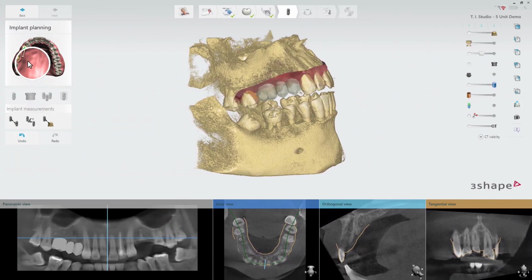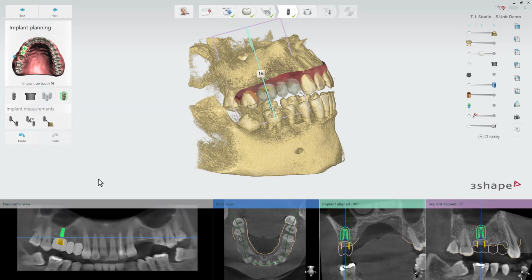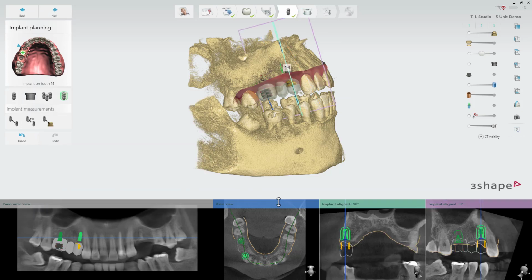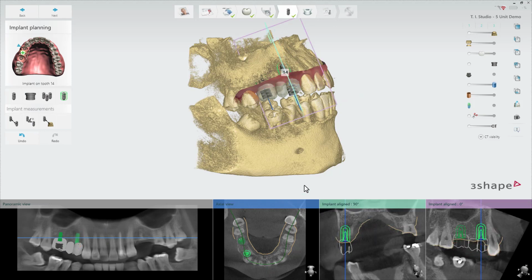In the implant planning step, you can set 2 implants instead of the 3 proposed, or perhaps add an extra anchor pin, if the situation requires it. The anatomy design will be kept for all crowns, saving you time as you do not have to go back to the order form to change the indications here. Use the regular Implant Studio tools to finalize the planning.